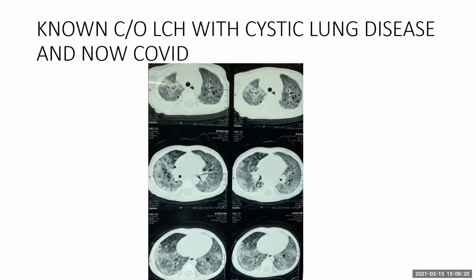Somebody wrote any butterfly vertebrae. I don't know if she's talking about the inguinal hernia case, but I think if it would be, madam would have told it. Why can't that be a PCP, madam? This one? I'm assuming that she's talking about this one. Yeah. PCP is more like perihilar, right?